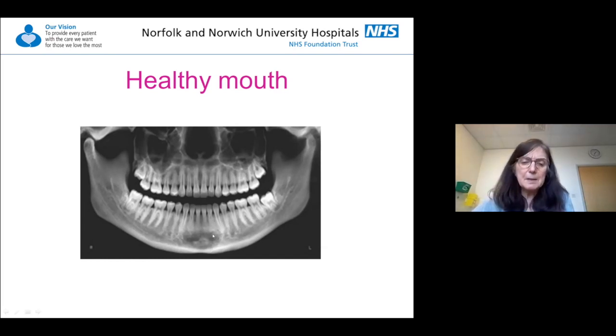You can see all the things I've spoken to you about already, such as this midline area of blurring. You lose the definition around the roots of the incisor teeth, but really quite a nice, crisp view involving the molar teeth and their roots. You can see the pulp canals and pulp chambers of the molar teeth quite clearly, and you can also see this rather bright cap, which is the enamel cap, and strong surface layer of teeth.